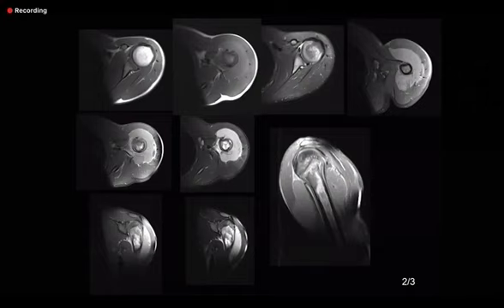Will you keep osteomyelitis in your differential? I think osteomyelitis would be less likely given a large soft tissue component within it, but I would correlate to the patient's symptoms to see if they have a fever, if they have a high white cell count or CRP count. But I think Ewing sarcoma will be the most likely differential.